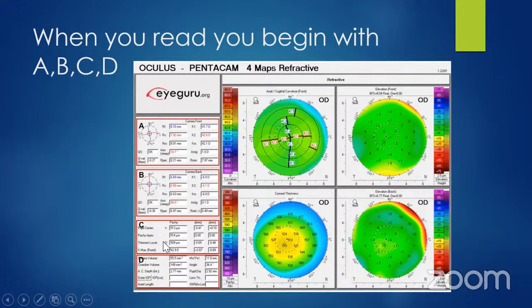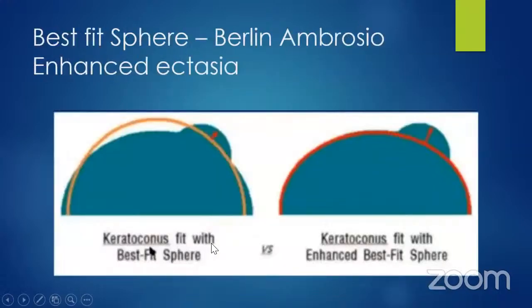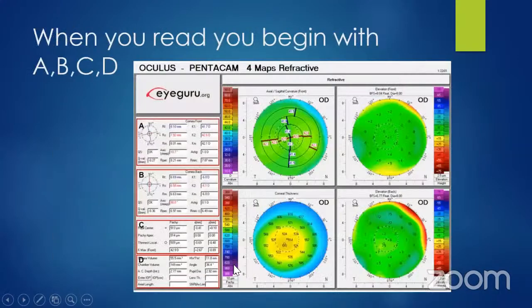So what is more important is the thinnest local. That is a circle with a clear white center. What you need to look at is this X and Y coordinate. It's a simple thing like your graph. So the X and the Y. If the Y value is displaced much more than the normal, then that's when you get suspicious, because the thinnest local should be located close to the pupillary center and to the Pachy apex. And the last one is showing the anterior segment values.